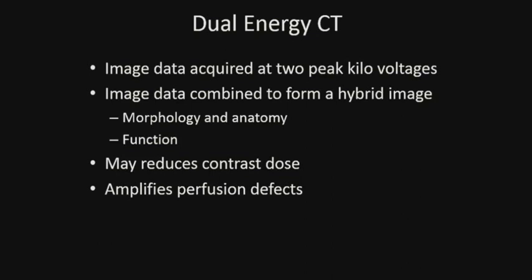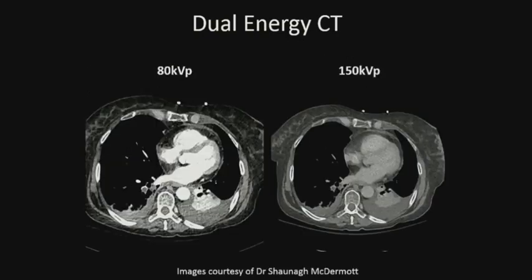The facility of this is that a small subsegmental pulmonary embolism, which may be imperceptible by CT, is then better identified because a large area of decreased contrast enhancement can be interpreted on the iodine map images. And it potentially increases the sensitivity of CTPA, although data is still awaited.